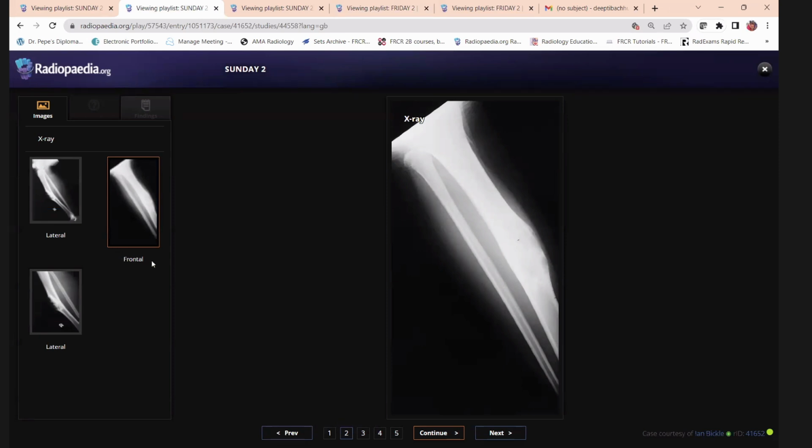Any other differential you want to keep here? It could represent non-ossifying fibroma. However, I would not expect it to be septated and expansile. So it could also represent aneurysmal bone cyst. However, this is most likely metaphyseal, not diaphyseal. But do you know the age? I have given you the age of the patient. It is 13 years. Ewing is less likely as I can't see any aggressive features. This could represent osteomyelitis, and Langerhans histiocytosis as well will be in my differential. Okay, we'll see the MRI.